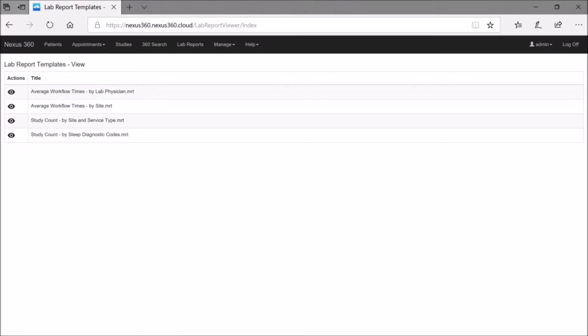So what we're actually going to do is we've got these 4 reports that just show how it generally works. So I'm going to show you what they look like. Then I'm going to show you the wizard tool, the embedded reporting tool that was used to populate these. Now, if you found these reports useful, we could actually provide them as default in your neXus 360 installation. At the moment, we don't, but we can do that if you wanted.